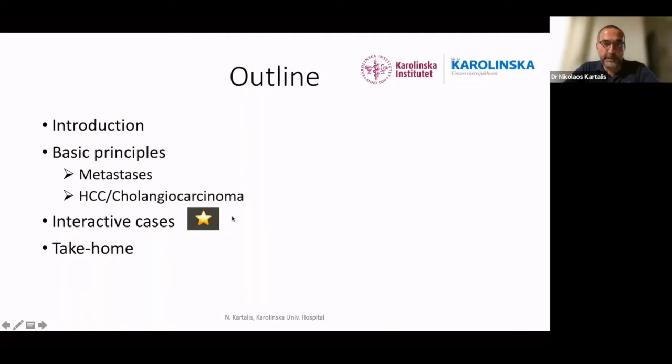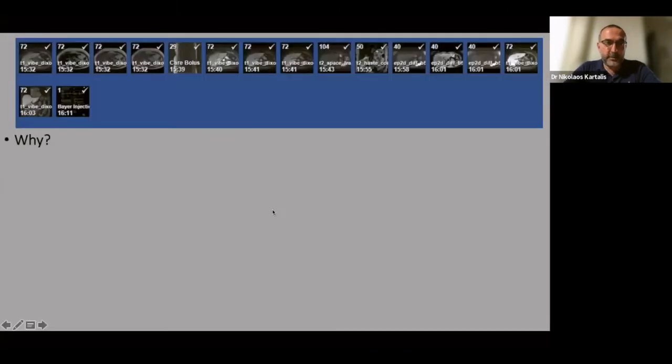And hopefully we will have time for some questions. If you have any burning questions during both my lecture and the case discussion, please post them in the tool so Martin can address the questions and we can discuss them. So starting from the introduction, this is actually the image of a PACS system, and I would like to go through how I approach this case, just to share my experience on the topic.